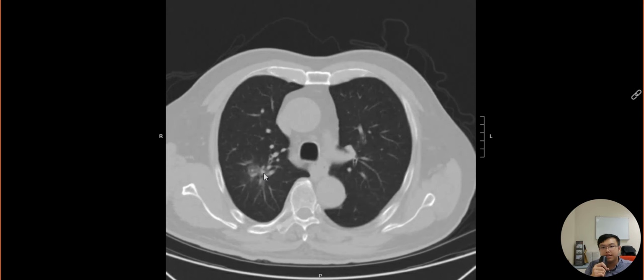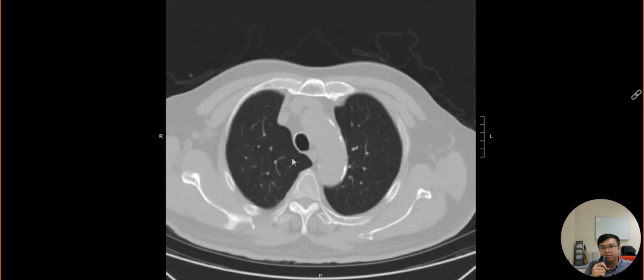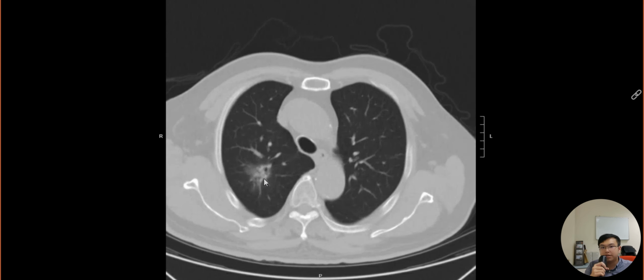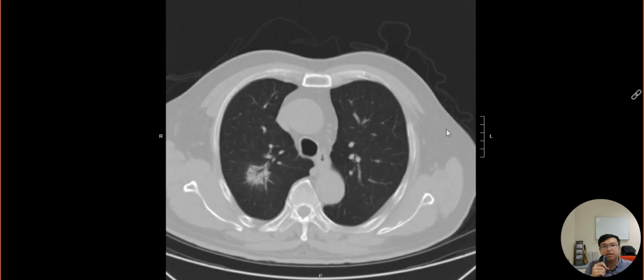Since this lesion is not near the major bronchi, an endoscopic biopsy is quite difficult. So we must do a CT-guided biopsy. But how can we do so?